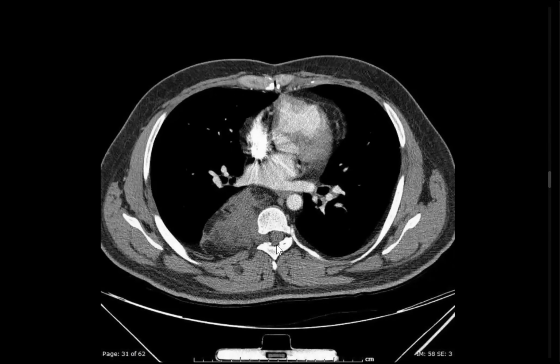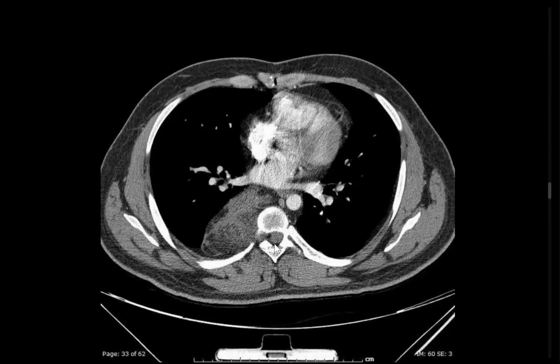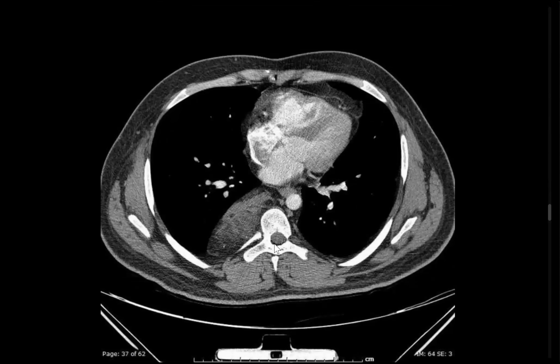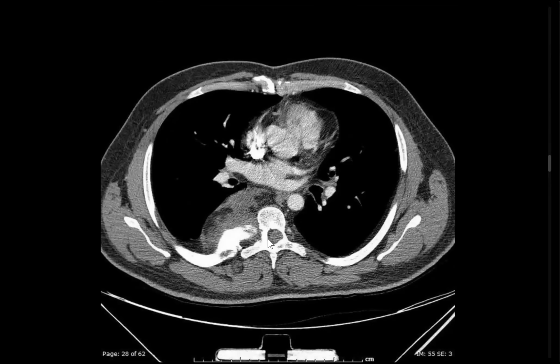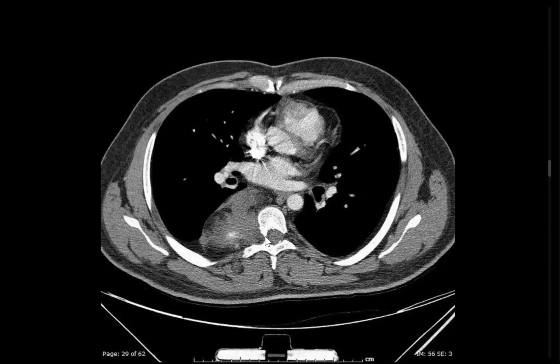I will review the bone window and also review it in the sagittal and multi-planar reformats. And for intraspinal extension, I would advise MRI to look for the intraspinal extension and the relation with the spinal cord. So again, sir, this is likely a tumor of neurogenic origin, and I will refer the patient to the referring physician and convey my findings.